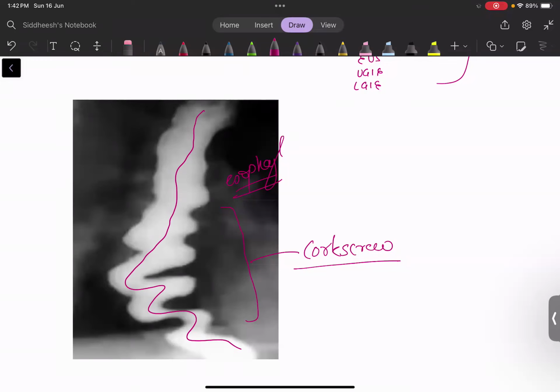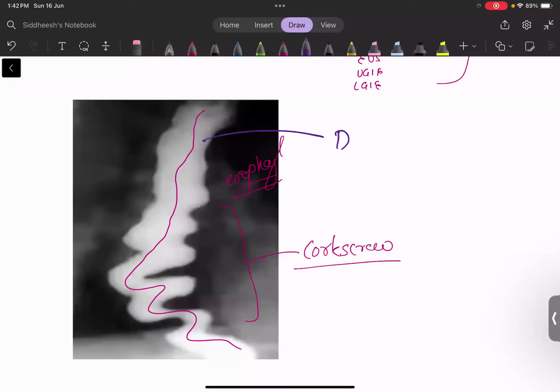So multiple names will be there, but you need to practice proper radiology and make the diagnosis. Don't rely on these unique names that we are giving for the memory part. Now, in this image my patient is having DES, diffuse esophageal spasm. Remember, in our GI tract a lot of movement will happen, a lot of spasm, from which your food will move forward from the esophagus to the stomach, from there to the pyloric part, then to the small and large intestine.